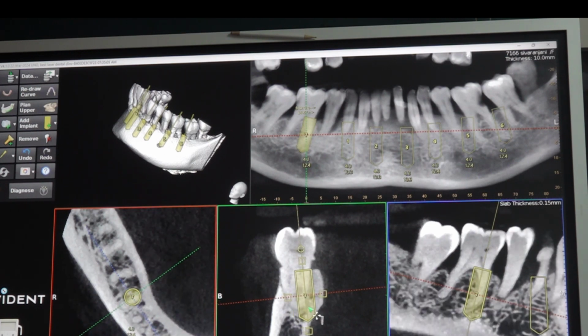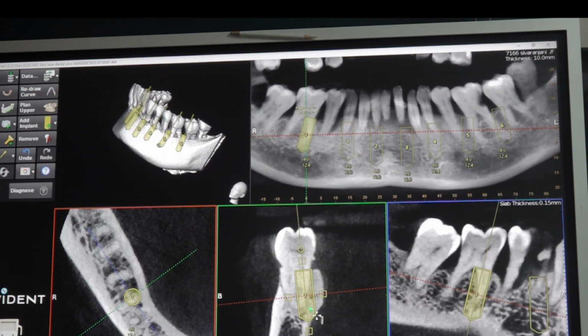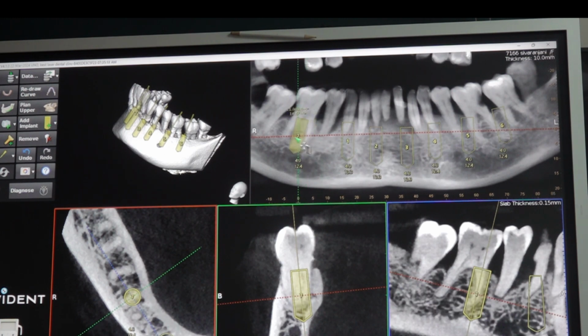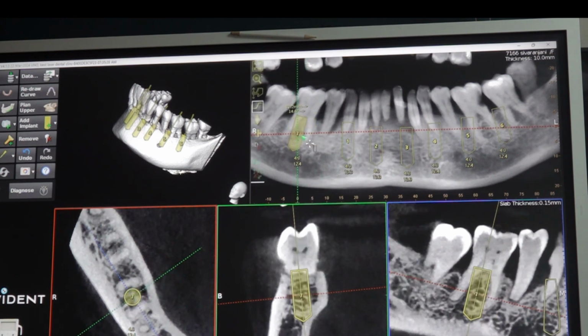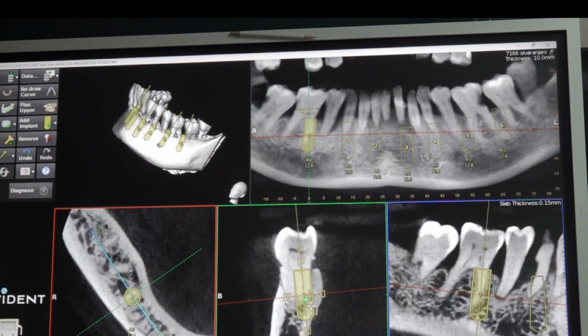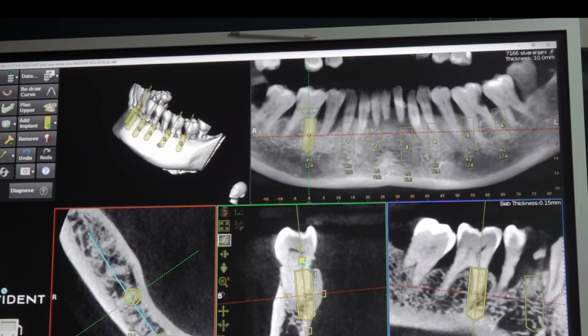So here along the mesial root, we are going to place. We are not choosing the interdental area because it is close to this defect area, right? So we are moving towards the mesial root. And we are not choosing the interdental area. Why? Because this interimplant distance will become more. So we can tilt it slightly straight. Very short implant. 10 mm. Okay.